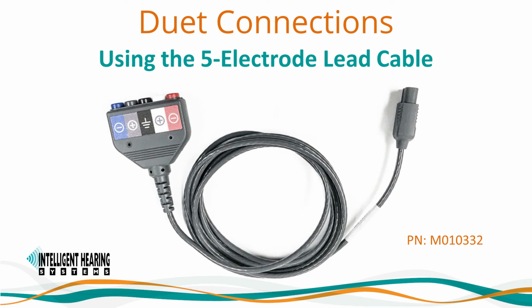Now let's repeat the same example by using the Duet patient cable for those of you using the Duet platform. You will need to use the 5 electrode lead patient cable, part number M010332, for eCochG testing.